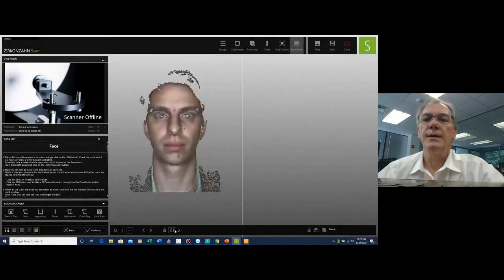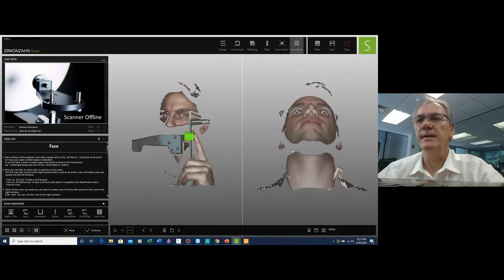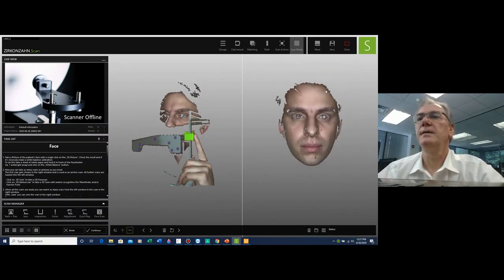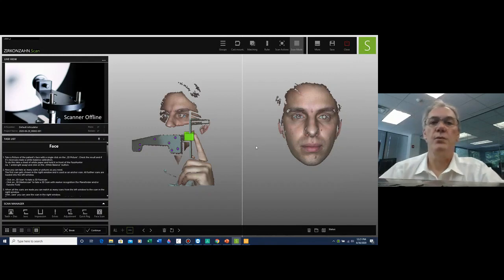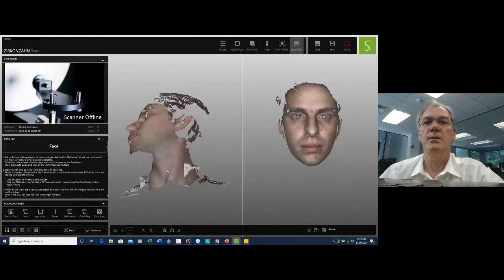So the goal is to create a 3D image, which we'll bring over to the right-hand side. It's always recommended to clean it a little bit, just in order for us not to have too many calculations. What we don't need is really worthwhile just eliminating from the image itself. And to this straight image, we are going to merge the 45 degrees. So we go to the left side, we seek the image. This one here is the one I need. We can go ahead and clean it.